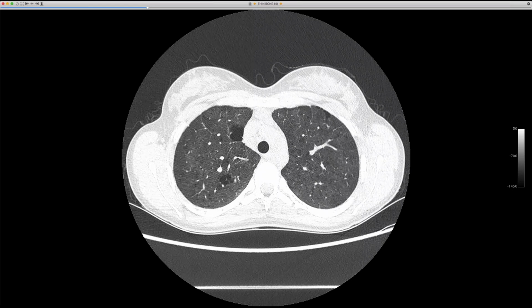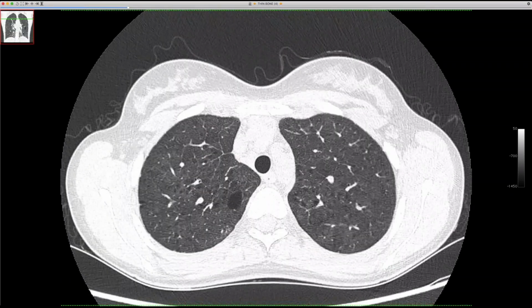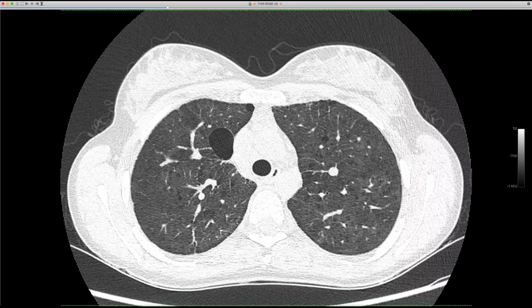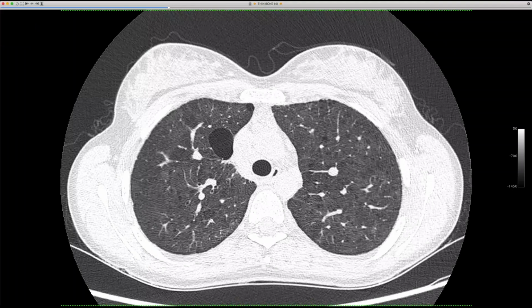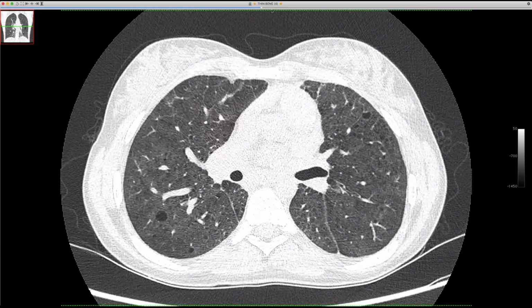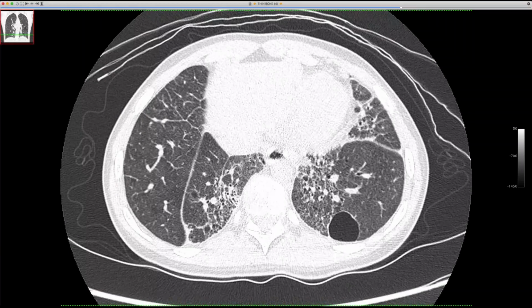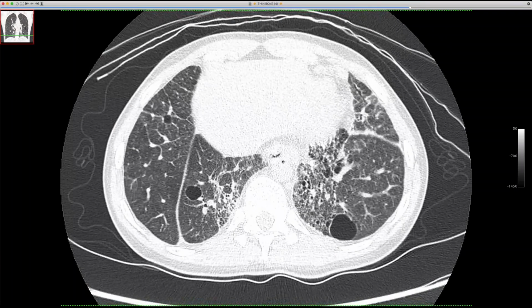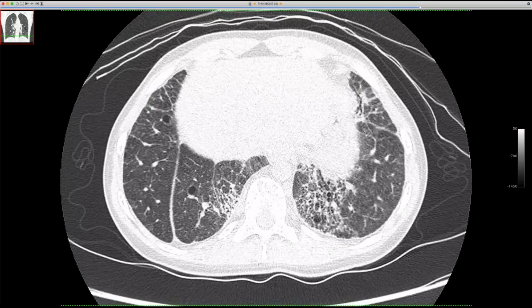And what's kind of interesting is she's got what looks like emphysema. We've got some emphysema, but she's never smoked. She's a non-smoker, no marijuana, no vaping, but has these holes that look a lot like centrilobular emphysema. In addition to these cysts, her lungs are diffusely dense. She's got reticulation, and then the lower lobes are really starting to look NSIP-like. We've got traction bronchiectasis, peribronchial reticulation. Her esophagus is abnormal. And then she has some septal lines down the bases as well.